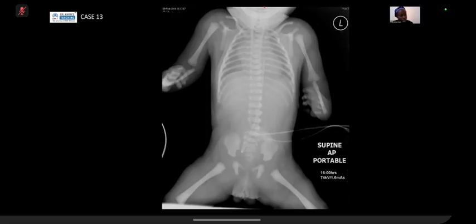So here we can see we've got a replogle tube in the proximal esophagus in keeping with an esophageal atresia. R is for renal, so all these patients will have renal ultrasounds to assess for any renal abnormalities such as horseshoe kidneys, duplex kidneys, unilateral kidneys, single kidneys, etc. And then L is for limb, and as correctly identified, you can see here that the patient is missing both their radial bones bilaterally, and the upper limb, the forearm appears shortened. So this child has limb abnormalities as well, which is what the L in VACTERL stands for.